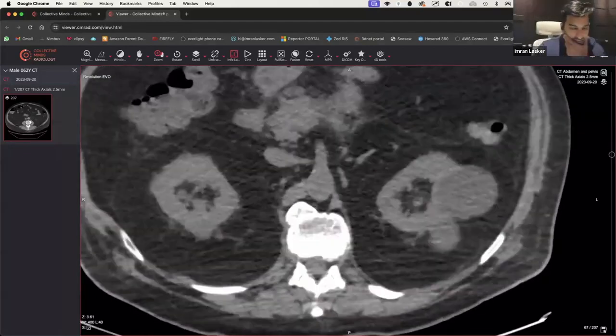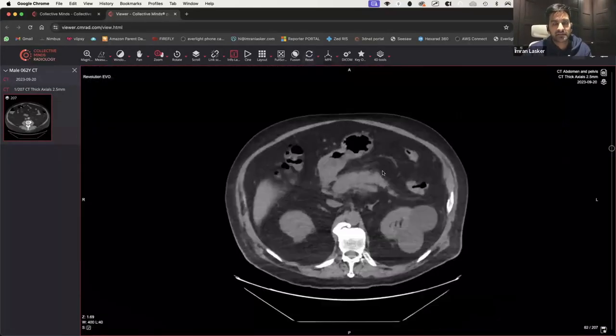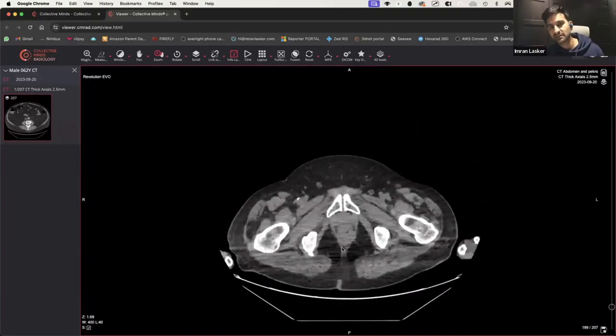And so the question I put to you guys was based on what you think the diagnosis is. And so, oh yeah, let's do that. Let's go reset all. I said is a bowel ischemia. So it's probably quite important that we do look at the bowel since I've brought that up. So bowel ischemia, let's have a look at the bowel.